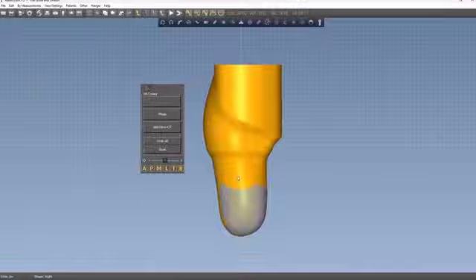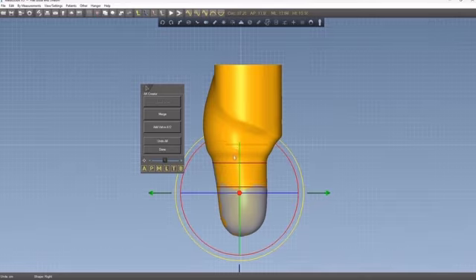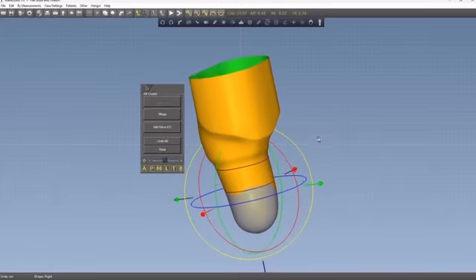And what we can do is indicate the area where it should merge the scan section, or the distal section, to the brim section. Right now you see a little bit of a ridge here because this is where the measurements don't quite match just yet, but don't worry, that's going to be taken care of. So this little alignment screen has come up, as we've seen before.